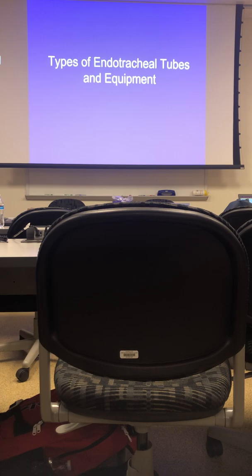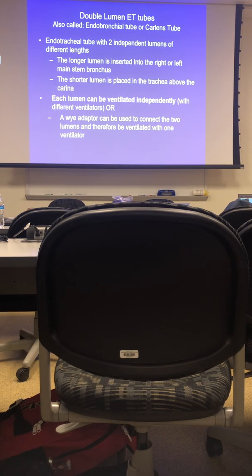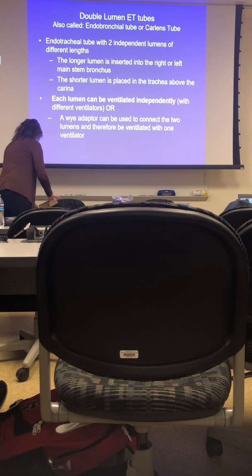Okay. So, different types of endotracheal tubes. Okay, let's see. We have a double lumen. I'm going to pass these out to you guys.